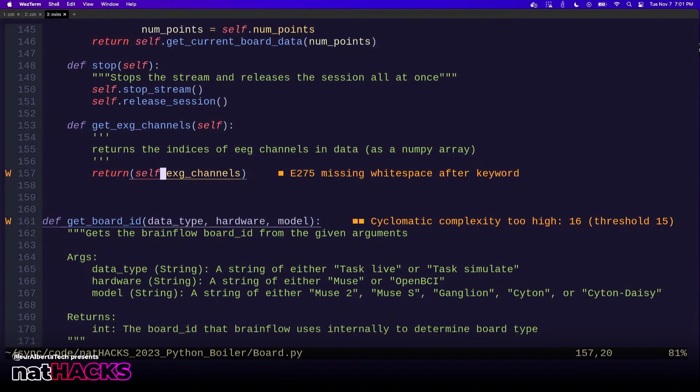And so you can look at that and infer that index 5 of this array is channel 0, index 6 is channel 1, and so on and so forth. And that's how the data is represented in BrainFlow. But I'm just going over this at a high level, because I believe tomorrow's workshop will go over connecting to headsets and working with the data in a lot more detail. So this is just giving you the gist of how it's formatted and how it works.